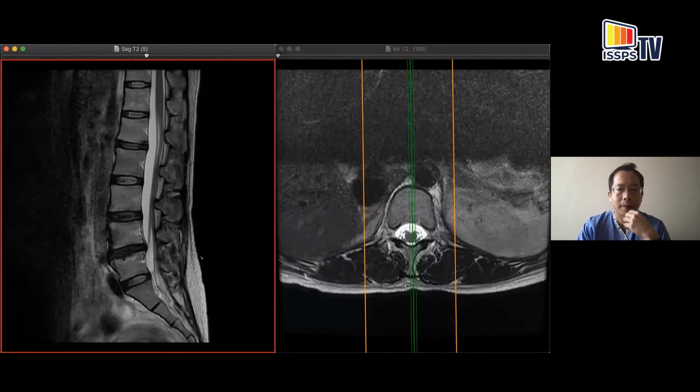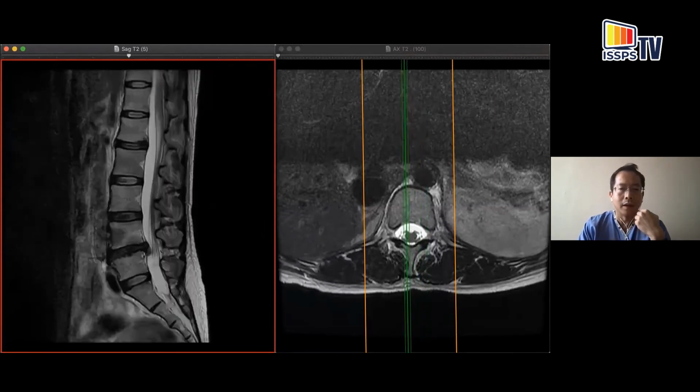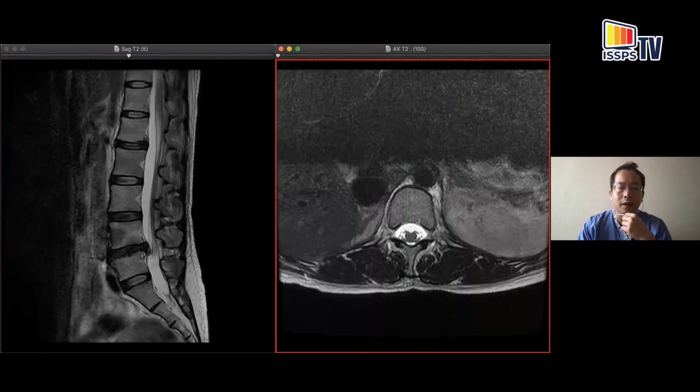This is a 39-year-old patient, and the 39-year-old patient has a large lumbar disc which has extruded inferiorly and caudally. And you can see how it's starting to deform the spinal canal. And this needs to be borne in mind if you were to perform any spinal procedure. A deformed thecal sac is not one where you would want to place your needle in, because the anatomy is completely distorted. And the assumptions that we make during paravertebral and central neuroaxis sonoanatomy can be distorted along with it. So you have to be careful.